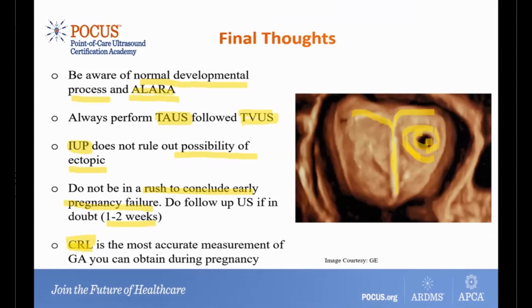So the lesson learned is to be aware of findings and morphological changes that occur during the first trimester, and if you see something echogenic in there, keep an open mind and realize that this may actually be an intrauterine contraceptive device that is coexistent with an intrauterine pregnancy.